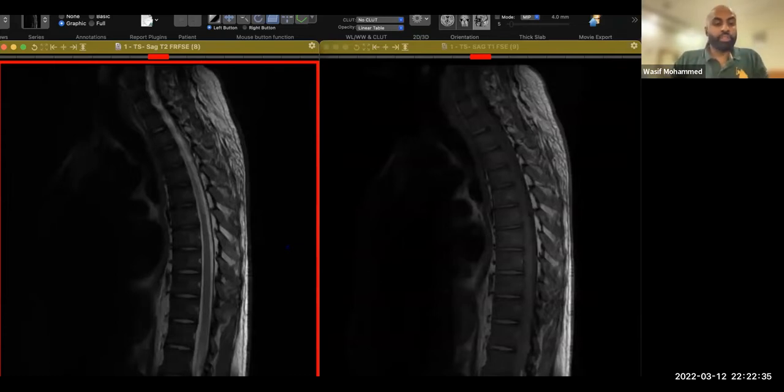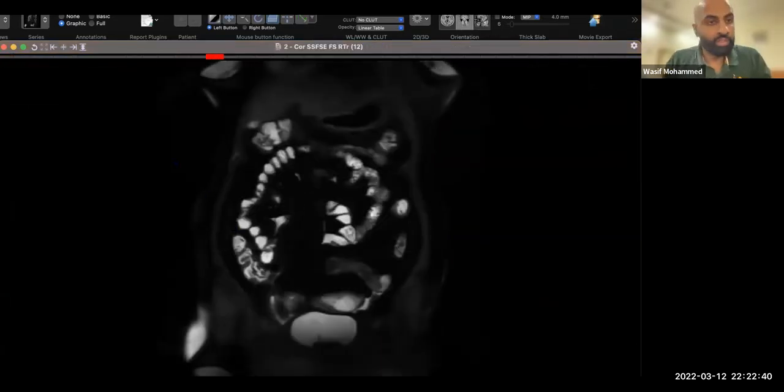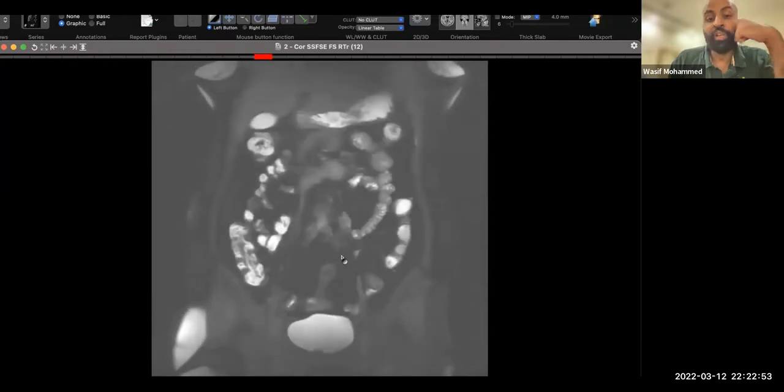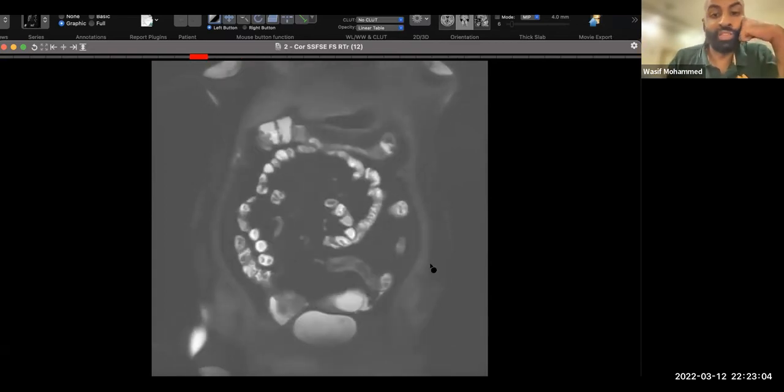So actually, MR enterography has been shown in the exam, and it's an exam case. They didn't used to show it before, but it has been shown. So we all should know at least, first of all, how to say that this is an MR enterography study. So the bowel is well prepared, there's fluid. I would advise you to look up how to prepare the bowel for an enterography study, by giving mannitol 1.5 liter 2 hours before the exam. The patient should be fasting. That can be asked. Techniques can be asked.